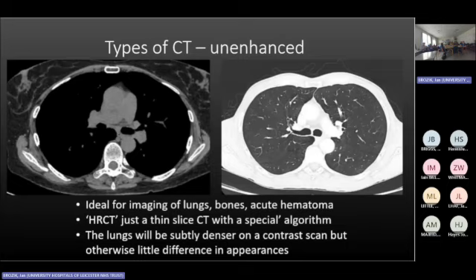And what I would like to say is, it could be a situation where you cannot give contrast, but you would like to know more about what's going on. I still would say let's do the CT. In some cases, it's quite rare, but even large clots in the pulmonary artery can be seen on a non-contrast scan. Yeah? I'm not saying we don't need contrast.